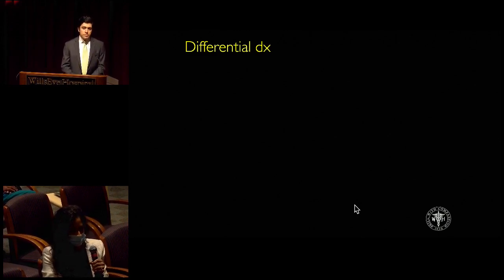So things that I think about when I see schisis, it'd be nice to know the patient's refraction. Myopic schisis can certainly look like that. Degenerative schisis. Always want to think of things like X-linked retinoschisis. Are there inherited forms, like autosomal dominant retinoschisis?